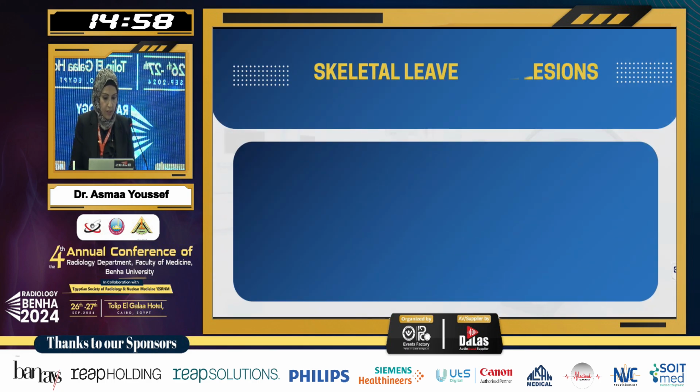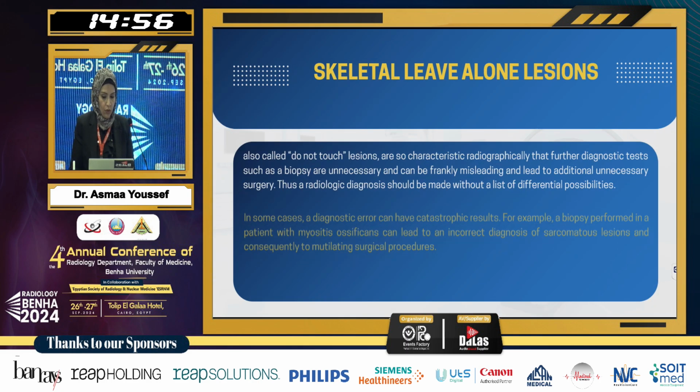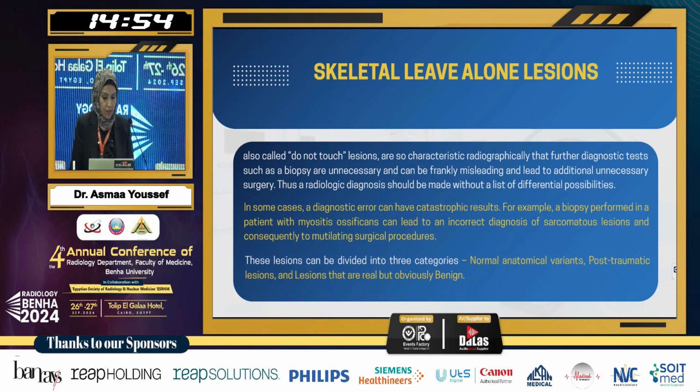My lecture is about an important topic, which is don't touch lesions in musculoskeletal imaging. Leave-alone lesions, skeletal leave-alone lesions, or also called don't-touch lesions, are so characteristic radiographically that further diagnostic tests, such as biopsy, are unnecessary and can be frankly misleading and lead to additional unnecessary surgery. Thus, a radiologic diagnosis should be made without a list of differential possibilities.